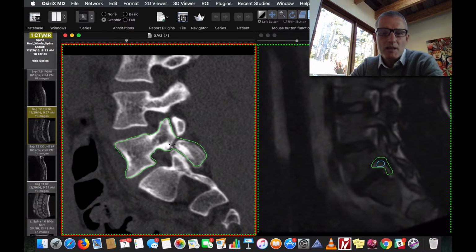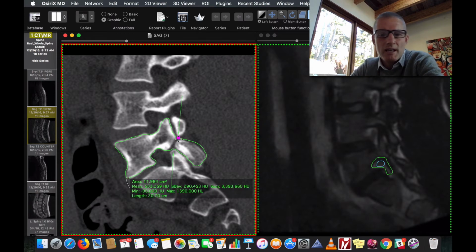So this little gap right here represents a stress fracture in the part of the vertebral body that's in between the superior articular process here and the inferior articular process here. And if I grab my arrows here, the way that I understand this condition to occur is that repetitive hyperextension of the spine in the adolescent spine before it's fully developed creates a stress fracture by creating a nutcracker-like effect or repetitive squeezing of the pars interarticularis by the L4 vertebral body on the S1 vertebral body.